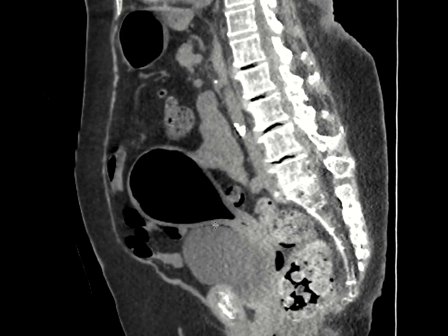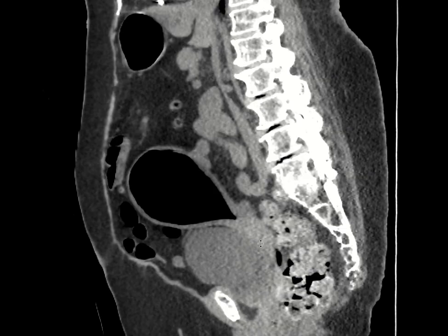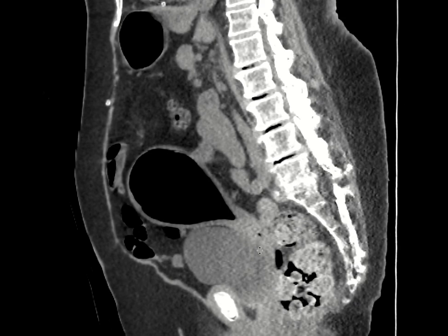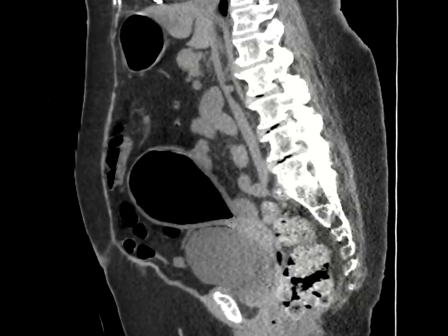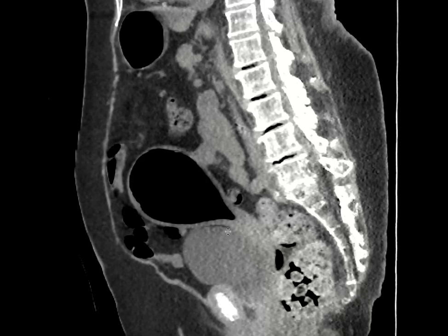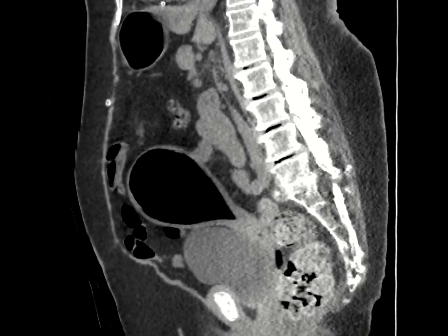This patient had over 10 vaginal deliveries, and so it was thought that this is probably related to incompetence of the endocervical canal, and air would come in here and get trapped within the endometrial canal. So this is just a case of pneumouterus, and in this case it was believed to be a benign etiology.